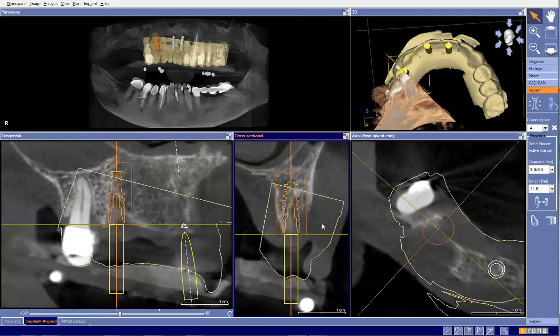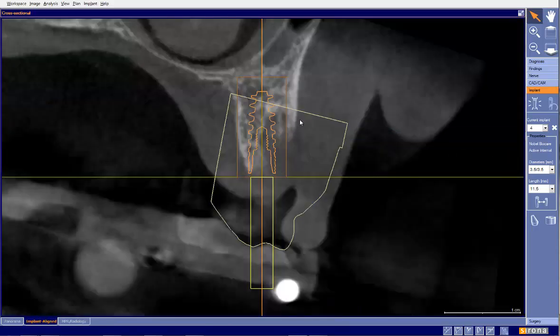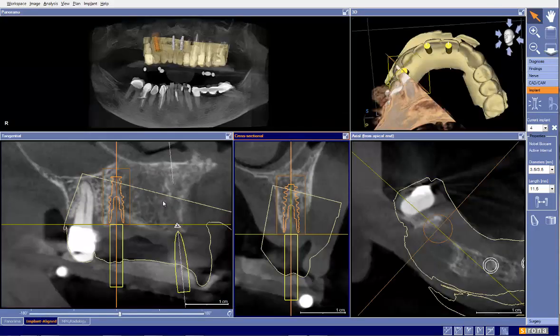And my first question here is going to be this buccal defect. I don't know if that is simply left over from the extraction, needs time to calcify into the bone to remodel in, but at the 4-month mark that should be there. So I'm very concerned that that implant may not be totally in bone. That doesn't mean that it can't be placed and then grafted. But at this stage, we want to try to simplify things.